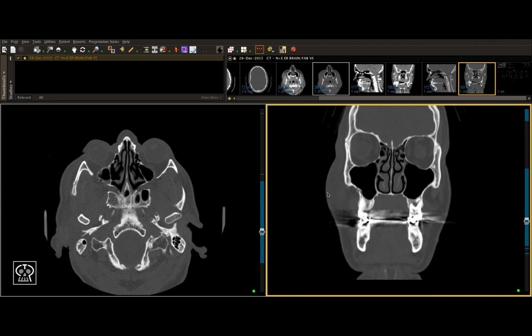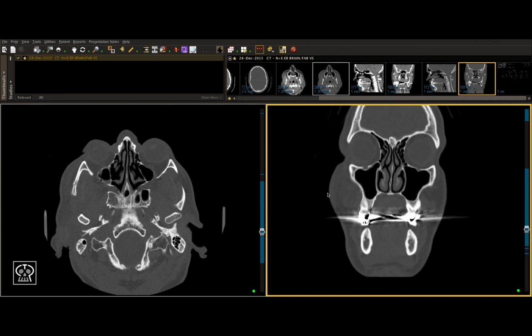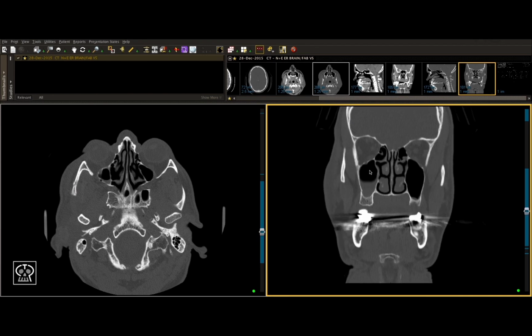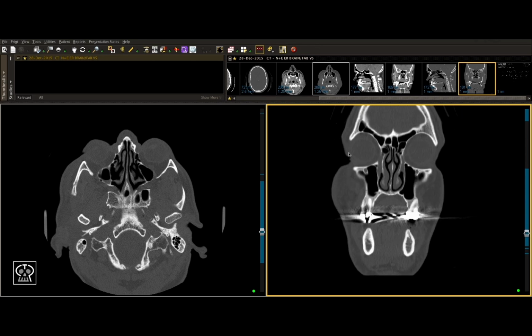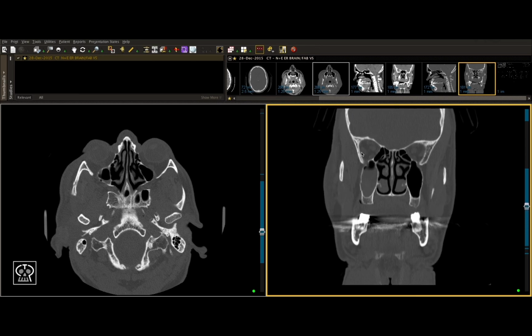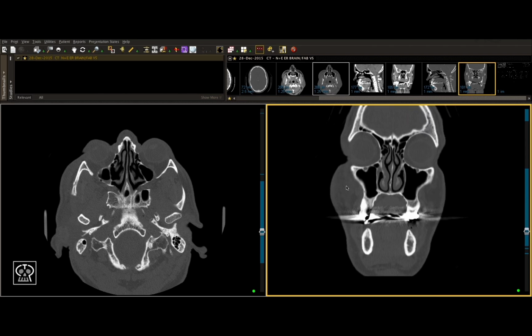As usual, we would look at the zygoma and all other angles before concluding our scan, including looking at the orbital floor, for which we can see no fractures. We would look at the ZF suture here, the ZS suture internally, and we've already looked at our ZT.